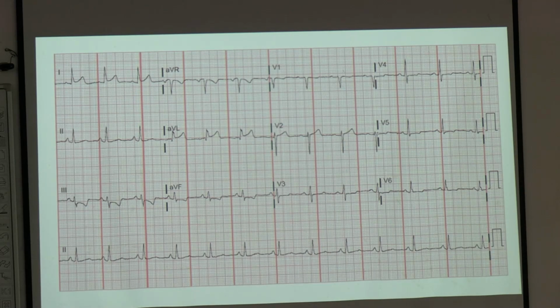So this is how the R wave progresses from V1 to V6. In V1 and V2 it is majority downwards QRS complex. In V3 V4 it is 50-50, some upward, some downward, right? V5 V6 it is majority upwards. So this is how the R wave progresses. So we call it normal progression of the R wave.